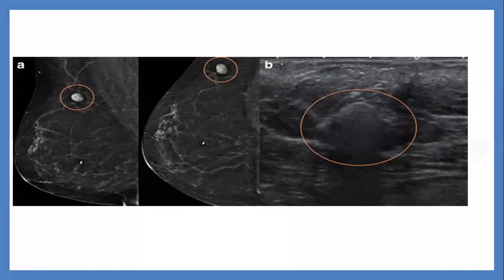You were going well. Your description signifies what you said. It demonstrates a circumscribed oval-shaped, high density mass on mammography, and well defined on ultrasound. This sign for me is a snowstorm appearance. Excellent. What does it indicate?